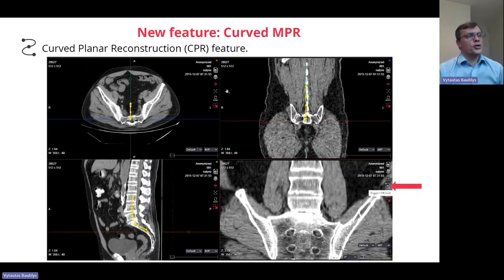This function, which I am really amazed by, and how it was created, I'm really grateful to our R&D team, which worked to create this MPR functionality for the curved functions. Next step after this is achieved, we're going to create a specific dental view for the curved MPR, which demands some extra features. But this is a first step also to dental curved MPR.